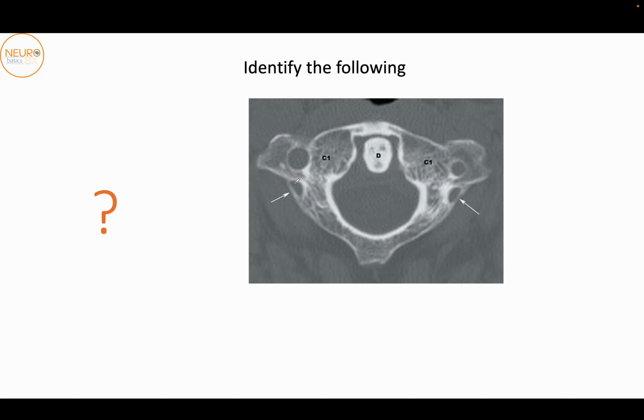Can you identify what this structure is? So you can put down the answers in the chat box.